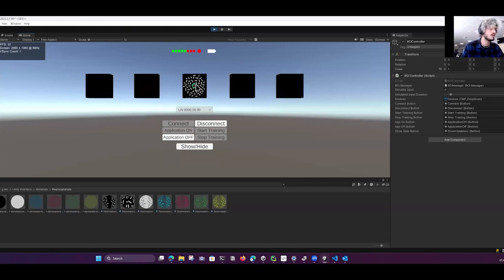The cube only shows if the duration is over the threshold that we decided. So I think it was 3 seconds there. Yes, so I can have it with 3 seconds. If I go above 4, I can get this one, but not this one. This one is 5 seconds. Okay, so you get the idea.